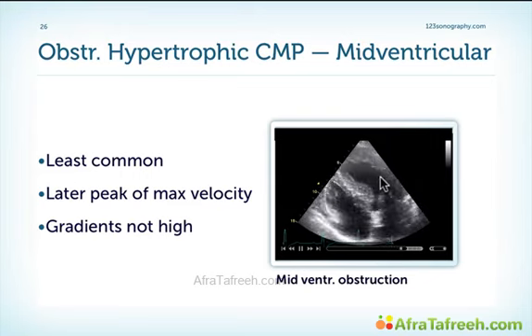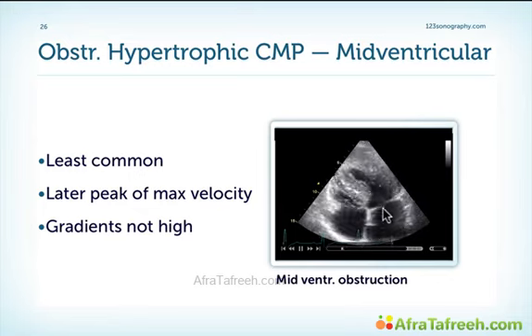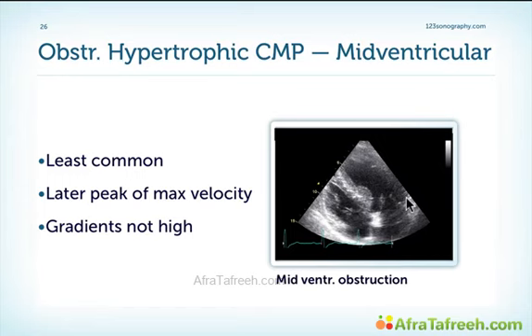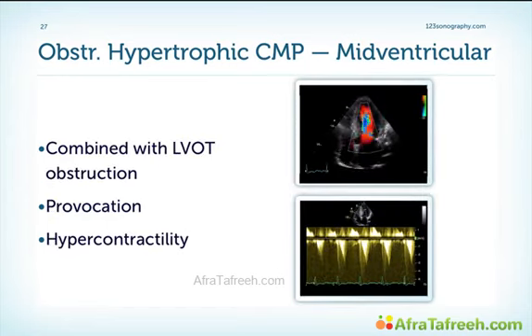You can nicely see that there is obstruction in the mid portion of the left ventricle, but there's also obstruction in the LVOT. So there's a combination of both forms of obstruction in this patient, and this is seen quite frequently: a combination of LVOT obstruction with midventricular obstruction.